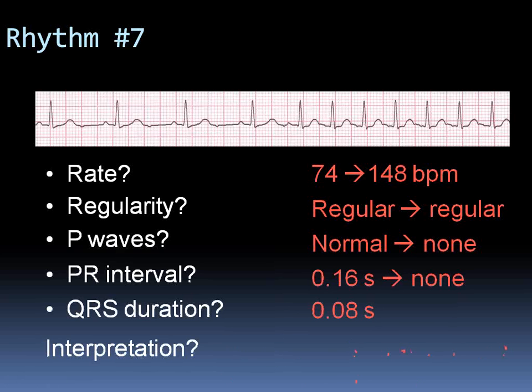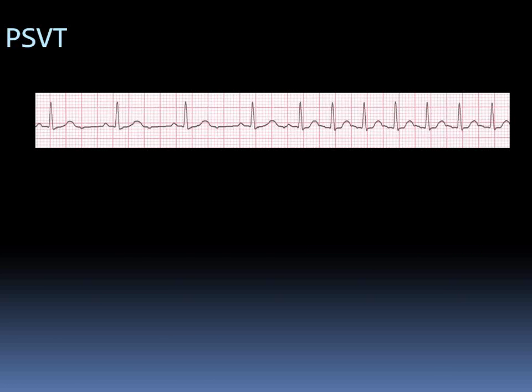Okay. So now we're going to go to the next ECG.